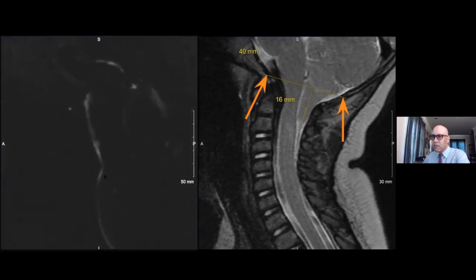This patient on a CSF flow study actually has slight narrowing of the CSF space ventral to the brainstem at the level of the foramen magnum, but there's bidirectional flow of cerebrospinal fluid. Most importantly, upon a detailed neurologic exam by a neurosurgeon, this patient was asymptomatic. There was no syringohydromyelia. There was patent CSF flow dynamics at the level of the foramen magnum. And so this patient was just observed.